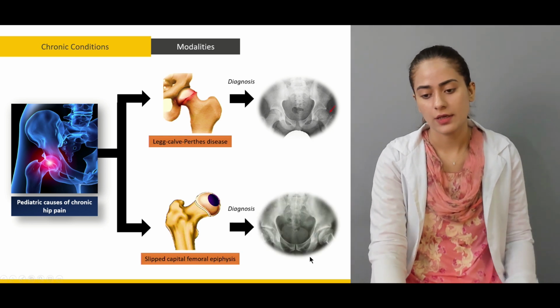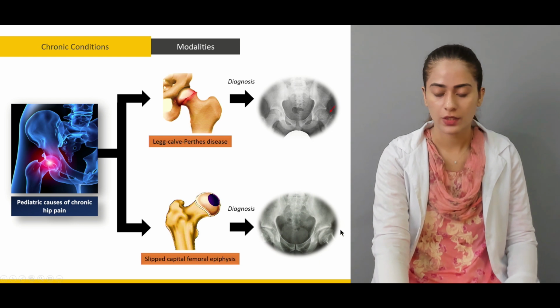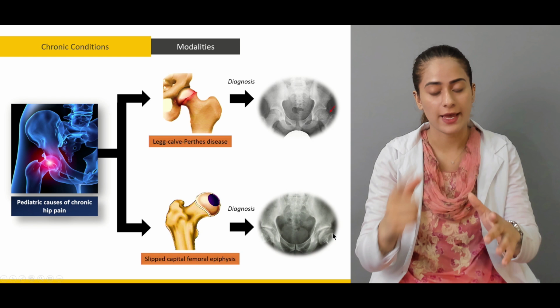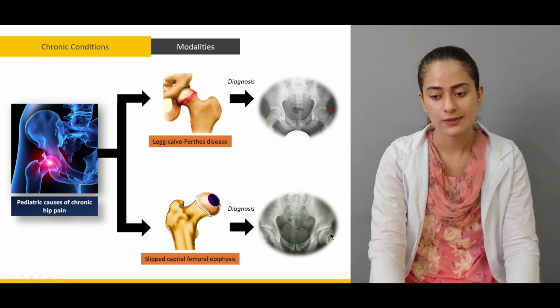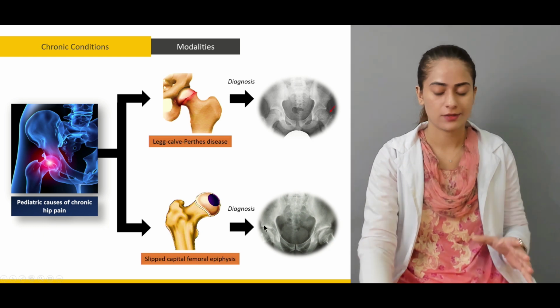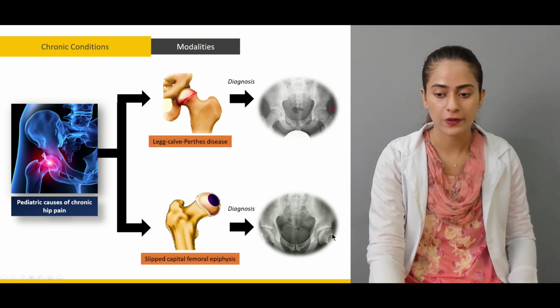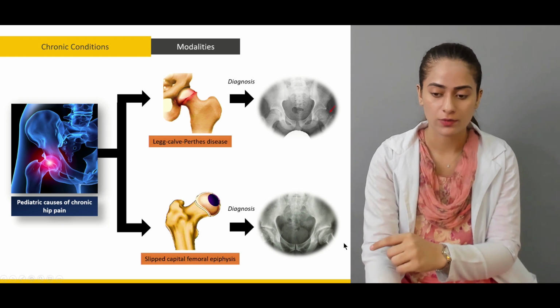So the diagnosis is like this. Here the movement is actually of the head. This should have been here like this. It would have been better if we had the entire picture, but let's just focus here. The greater trochanter is not visible here, but it is actually behind.